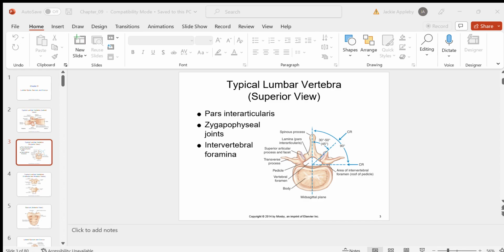Most of the time we like posterior obliques. In fact, what I'm going to talk to you about today are the posterior obliques. But just remember, if a right anterior oblique does something, then the exact opposite does the same thing. There's a similarity between that position and that position. They show the same thing. They would both show the left side. It's just that in the anterior oblique, you would see the opposite side. Right anterior oblique shows left side, whereas the left posterior oblique will show its same side, the down side.